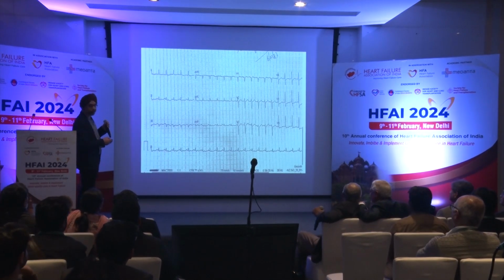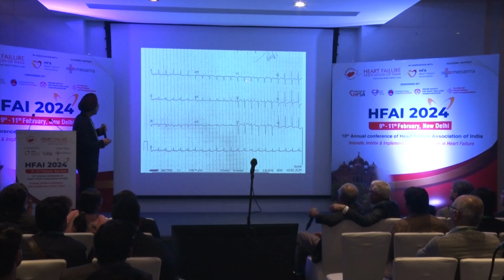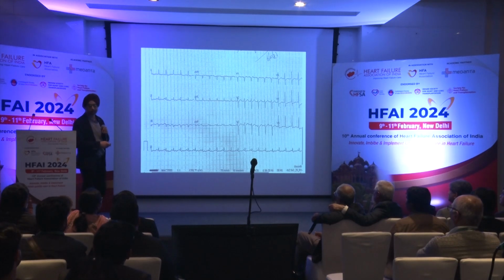So can the heart rate sinus go to this level? So 300 beats per minute sinus can't go. So it has to be somewhere else. So we now clear that this is a P wave, this is a P wave. For atrial tachycardia versus flutter, flutter has to have no isoelectric line. You see this isoelectric line? So there is no saw-toothing pattern. So it is against flutter.